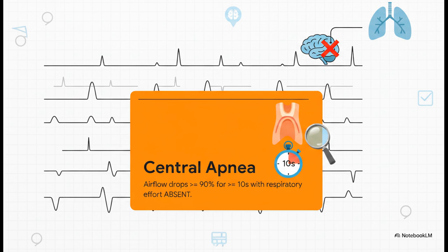But here is the massive, game-changing difference. Respiratory effort is completely absent. The airway itself might be wide open, but because there's literally no respiratory drive coming from the central nervous system, the chest and abdomen just don't move at all.